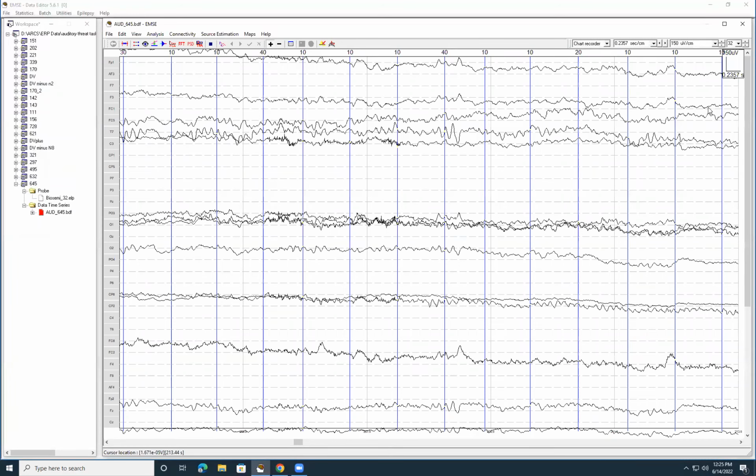You'll notice that there's a lot of blue event lines, and that's because this is an auditory task where it feels like there's almost continuous noise, basically. As a participant, there's almost constant noise with little breaks, little pauses, and so these events are showing you that there's a lot happening here.